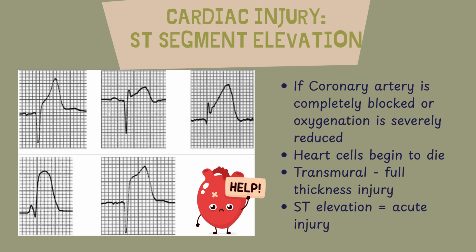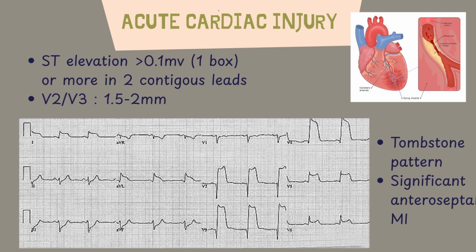And it tells us that we might be dealing with a STEMI, an ST elevation myocardial infarction. So how much elevation is considered significant on ST elevation?